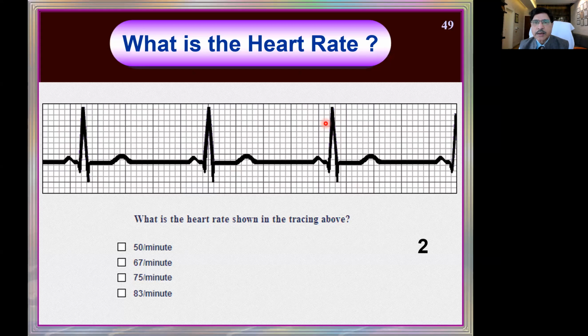what is the heart rate in this ECG? Okay, this is the thicker line here. So the next thicker lines are the 300 line, 150, 100, 75, 60, 50, 43, 37. This is what we know. But the QRS complex occurred at 1, 2, 3, 4, and 5. That is, 4 is 0.8 and 5 is 1, isn't it?